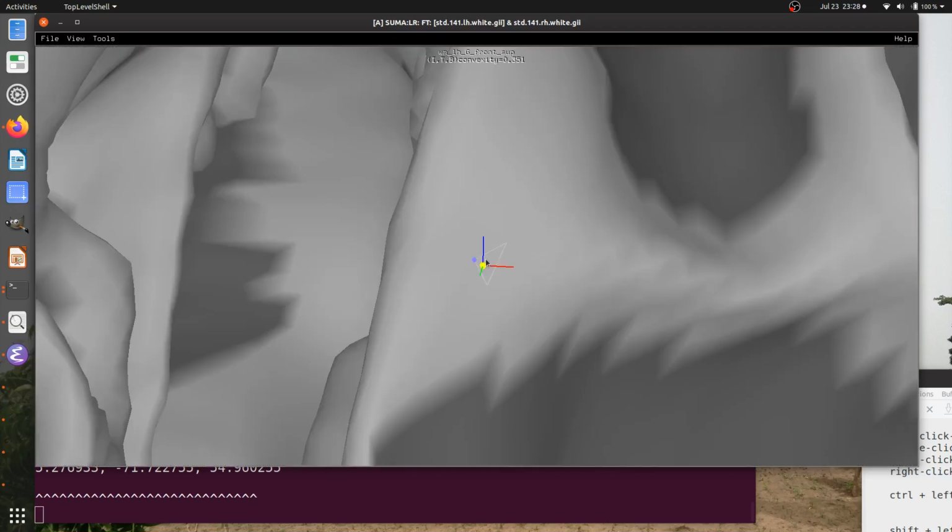Okay, so that's what these pieces of information are actually telling me. So here you can see I can click at a place where it's kind of obvious that it's triangular. Again, this is the surface area within which I've clicked, and then the purple node is the node closest on the mesh to where I've clicked. And it's actually at this node where all the information that I'm getting takes place.